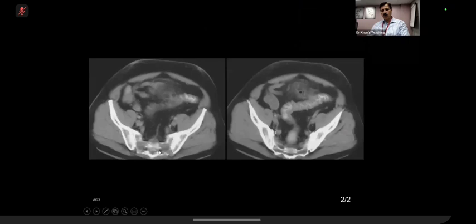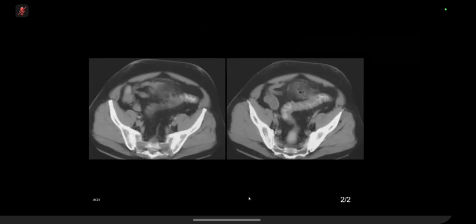Now, candidate 2, can you please tell me how are you going to handle this part of the findings, and what is your diagnosis for this part? Yeah. So there's a mucosal edema, there are serrated outline of the muscular mucosa of the sigmoid colon. There's adjacent mesenteric inflammation, and I can see an extraluminal gas locule centered in that mesenteric fat stranding. Appearances are suggestive of localized perforation of diverticular disease, in keeping with acute diverticulitis with seal perforation.